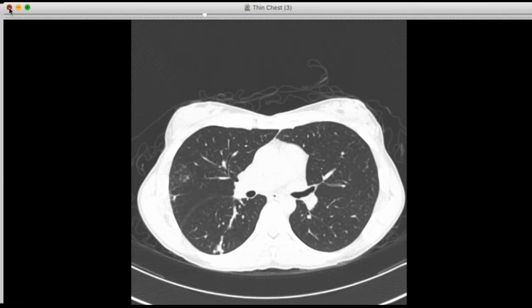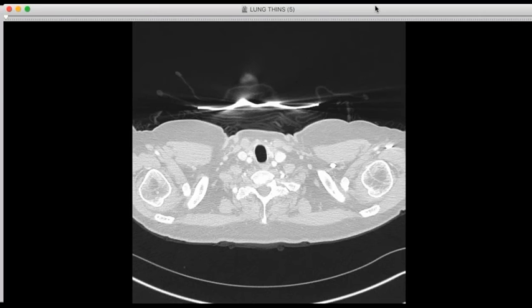Yeah, I think so. Yeah. Okay. This is a great case here. This is a fun one here. So this is a woman who works, and let me see, make sure I'm showing the right screen here. So you should be seeing now a CT scan.